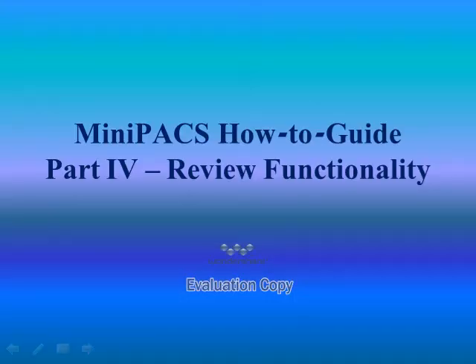This is the fourth in a series of instructional videos on how to utilize the MyLab Desk software. This software is useful in reviewing ultrasound images remotely from a personal computer or laptop. Here we'll be discussing review functionality.